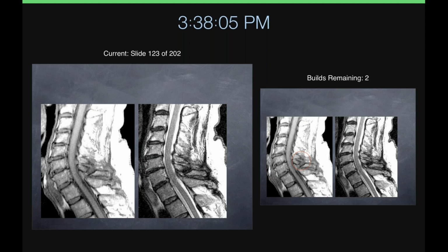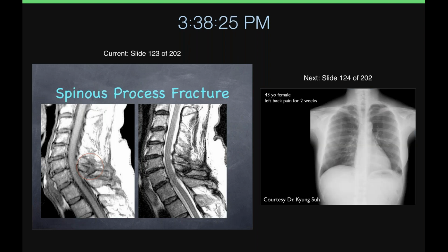Okay, there is exaggeration of the cervical lordosis. Looks at C6, C7, and it's like a fractured spinous process. Yeah, it looks more chronic. Yeah, so it's a spinous process fracture. This was C6. Often they occur at C7, but this is probably two levels here and also there.